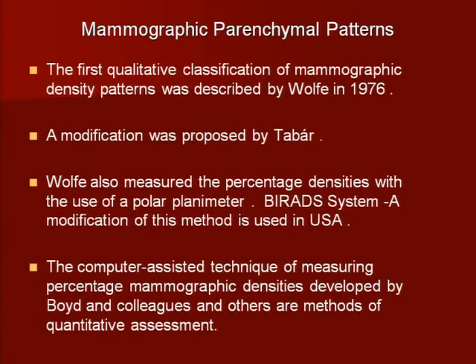That is basic normal anatomy. The other thing that you have to understand to know what a normal mammogram is, is to know the parenchymal pattern. And this parenchymal pattern is reflected by breast density. Sometimes you see lines, sometimes you see nodules, sometimes you don't know what you're seeing. So if you understand this parenchymal pattern, it will be easier for you to understand the normal anatomy.